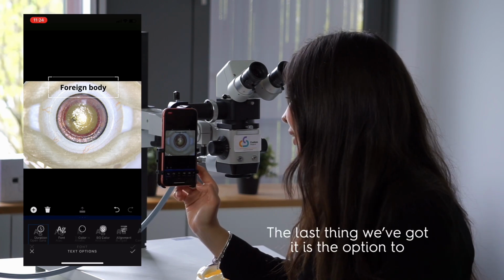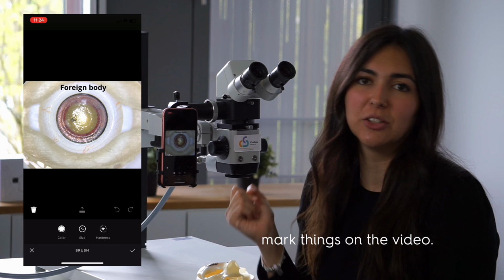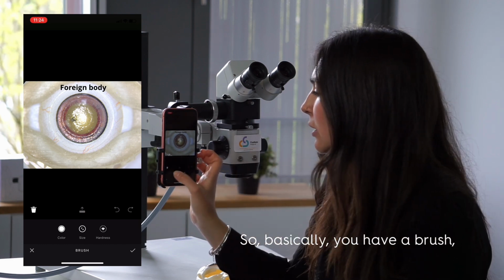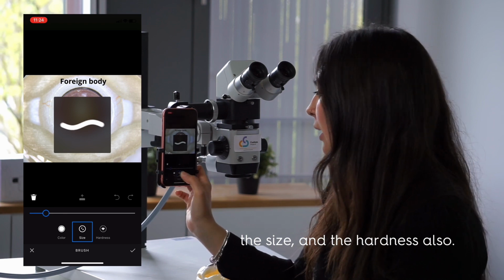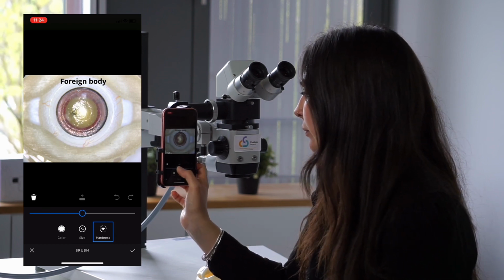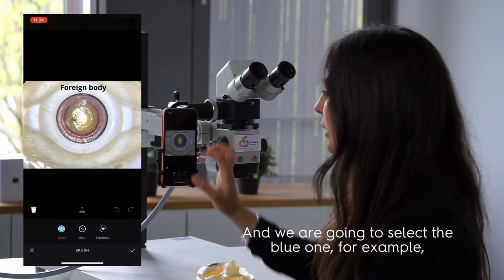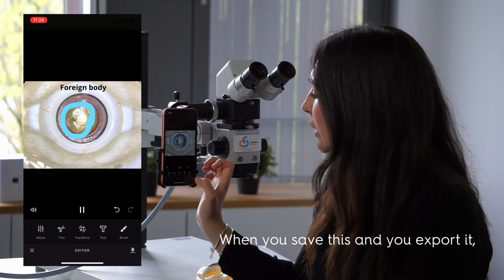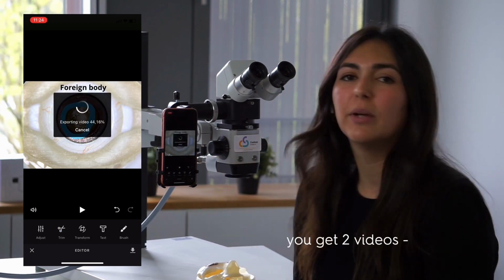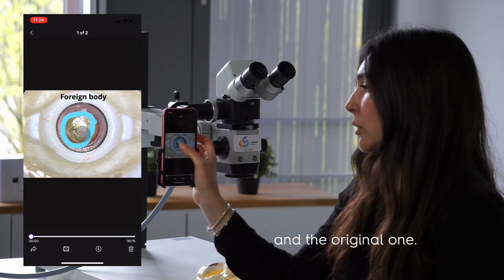And the last thing we added is the option to mark things on the video. So basically you have a brush. You can select the color of the brush, the size, and the hardness also. We are going to select the blue one, for example, and we're going to say there's something there. When you save this and you export it, you get 2 videos, one with all the edits you have done and the original one.